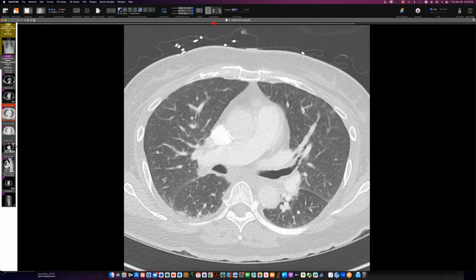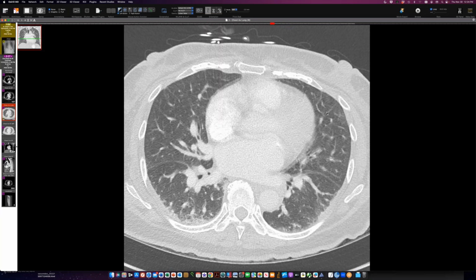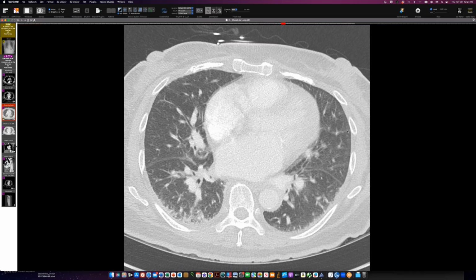So when you see vessels touch the pleura and you've got somebody with liver failure, you're probably seeing the radiographic findings of hepatopulmonary syndrome. So, I saw this on CT, and then the history is hepatopulmonary syndrome and hypoxemia. And then Sudhakar also picked it up, just from the imaging. So this is a case where it's well pronounced with these vessels going all the way out.